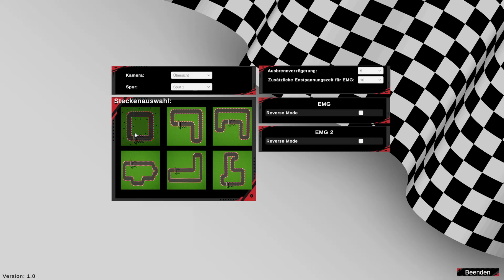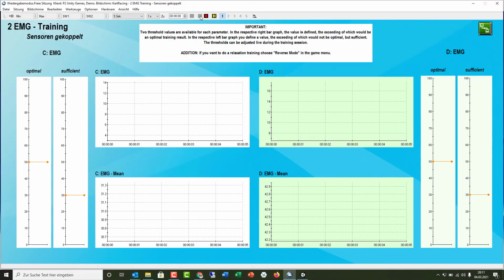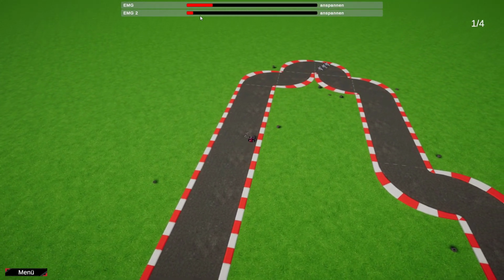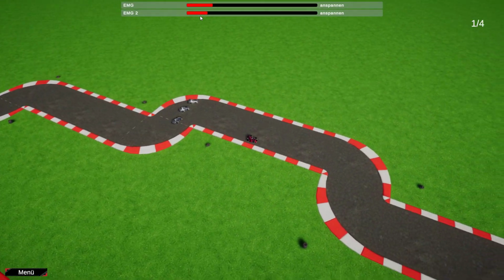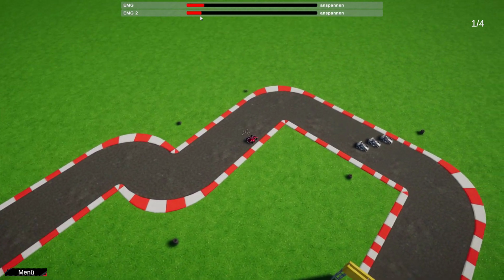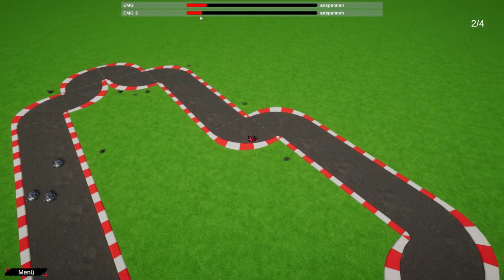We can choose the corresponding training track and start with our data. And here goes our car, and we can define if our performance is as it should be or not, and see here how we're well within the training scope. The car is racing, and if we're not, or just partially successful, the computer-driven cars are so much more efficient.